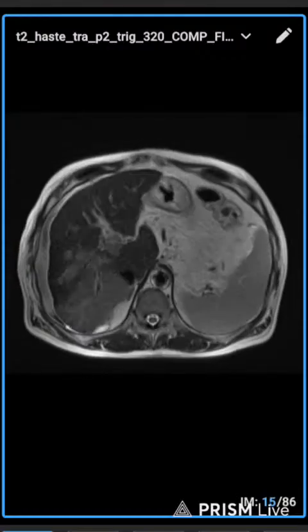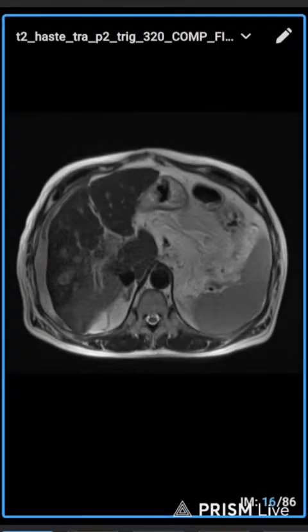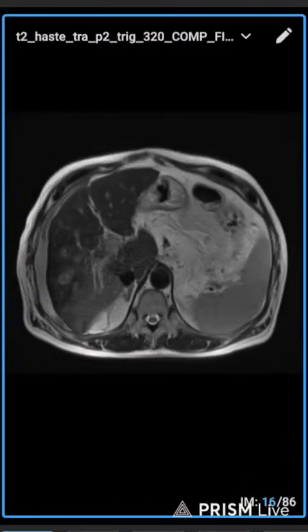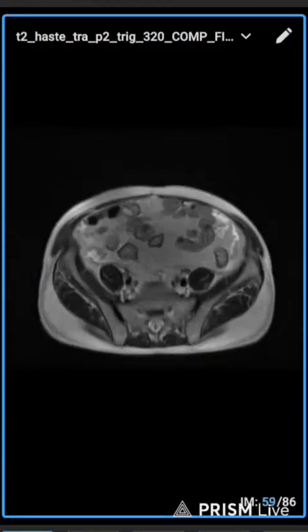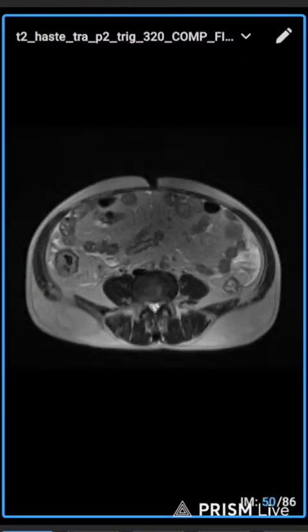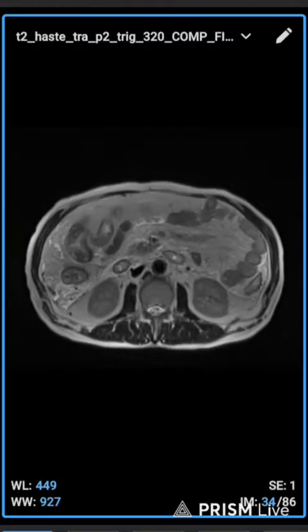So in T2, if there is a brighter contrast in any type of tissue, it contains more fluid in this area. After that we go to the next sequence. In T2 we find out there is a lot of ascites in this abdominal area. Here you can see bright area of the abdominal area. Peritoneal mesenteric area, it's called ascites, the whole mesenteric collection for that.